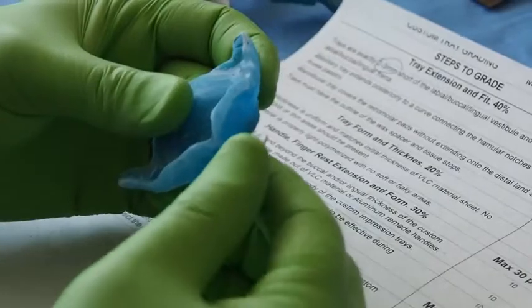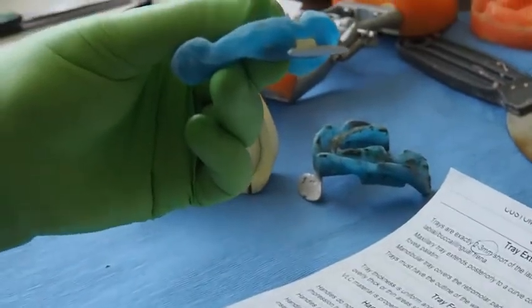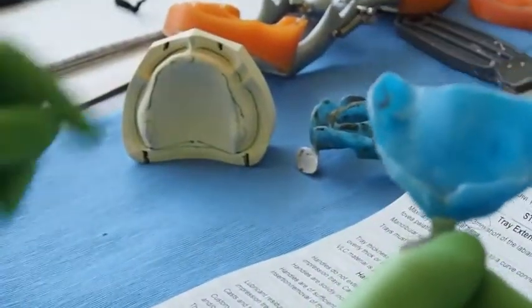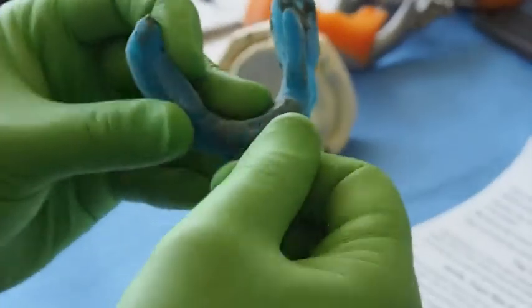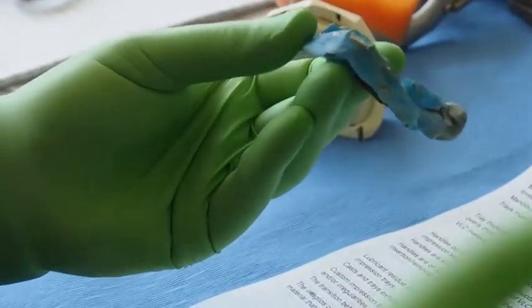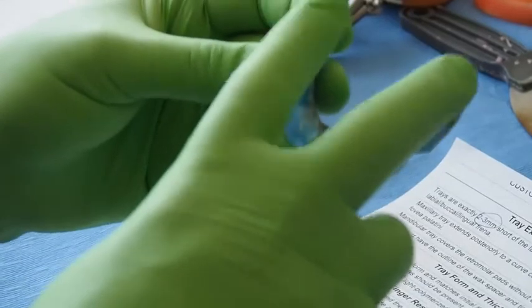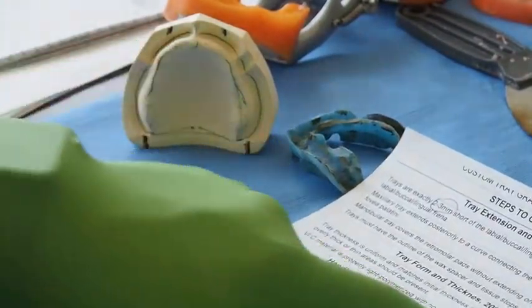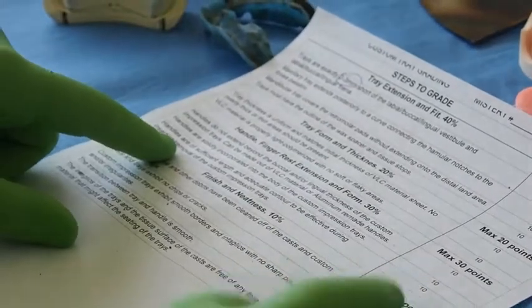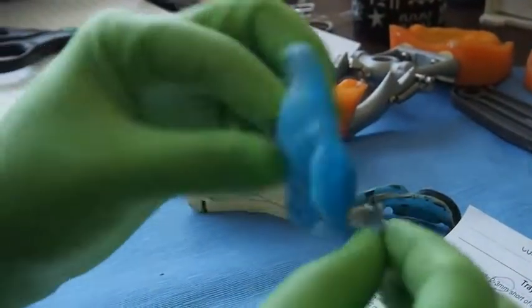We're going to be giving you, and I want everybody to use, the aluminum handle or finger rest handles in the lower. It's so nice because you can always bend them and put them however you want. When you're ready to pour them up, you break them, and you can also use them like that. Very important, you put your finger rest. Look guys, that's 30% of your grade. They have to be of sufficient length to be able to hold it, and that's why it's so much nicer to use these aluminum handles.